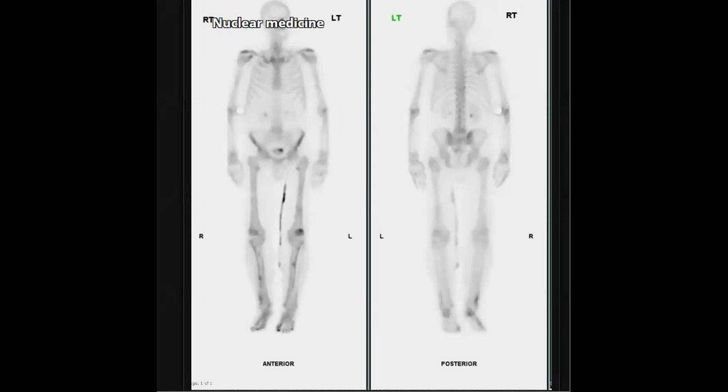Another question, and this patient has some chronic history of something. And the question for you: where is the finding? Some people think about yes. So how do we describe? If you find it and go to the diagnosis, that's nice, but try to describe so you can also take good marks in your description.